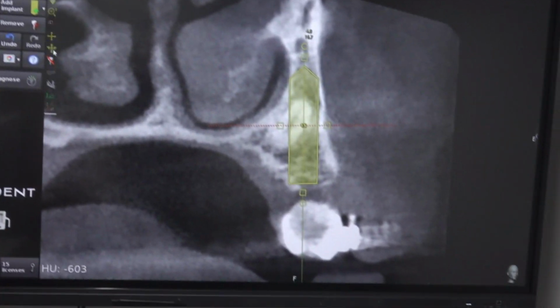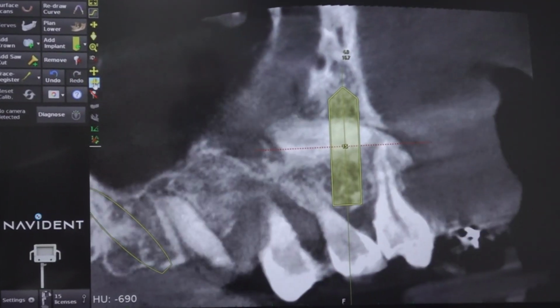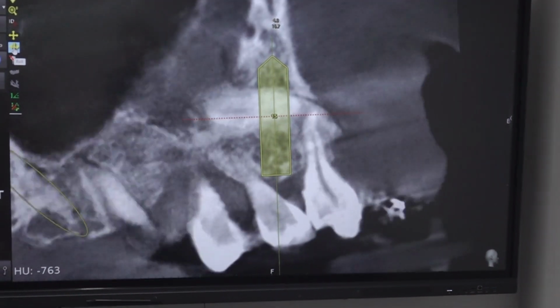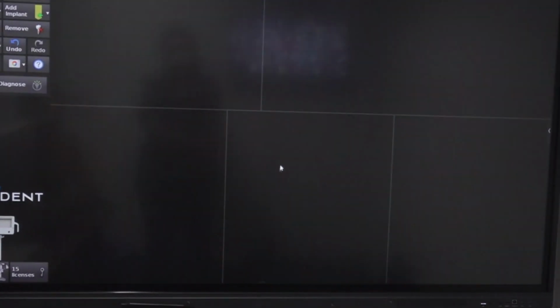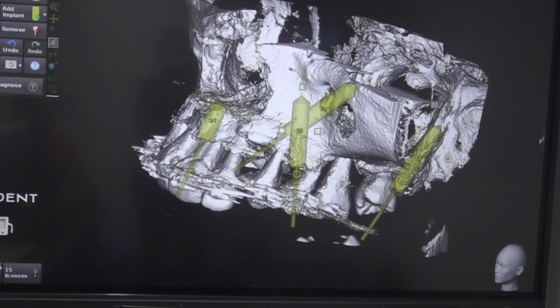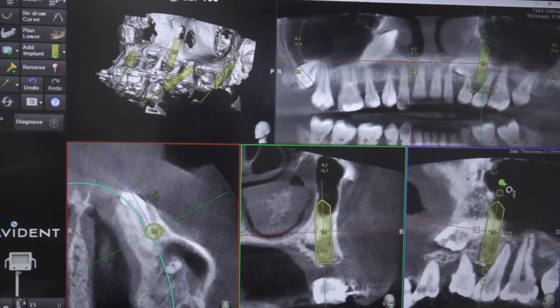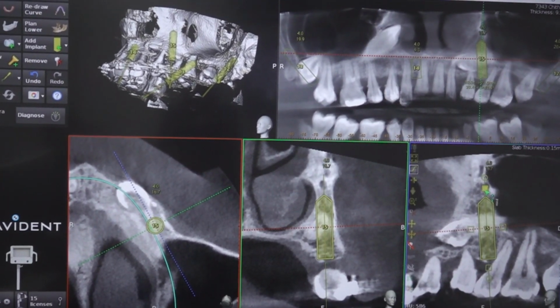We'll see the 360. If you remove the canine, definitely there will be very close to the sinus. Actually, the root is projecting into the sinus. So in between 4 and 5, slightly tilted, we are in good mode. We'll just check if we are not tilting here straight. If we are not straight, we will go into the sinus. So tilt it slightly. So this is the only savior on the left side.